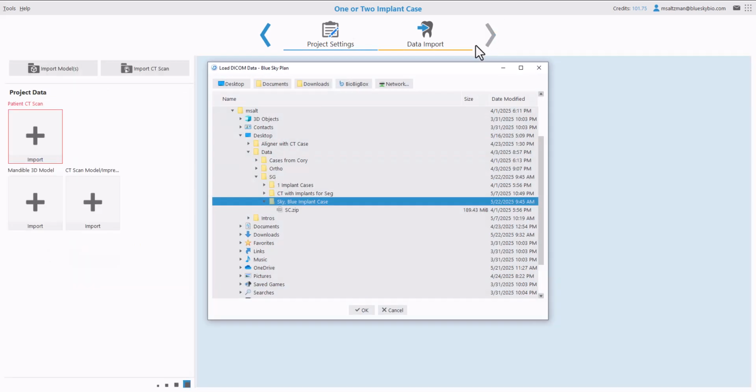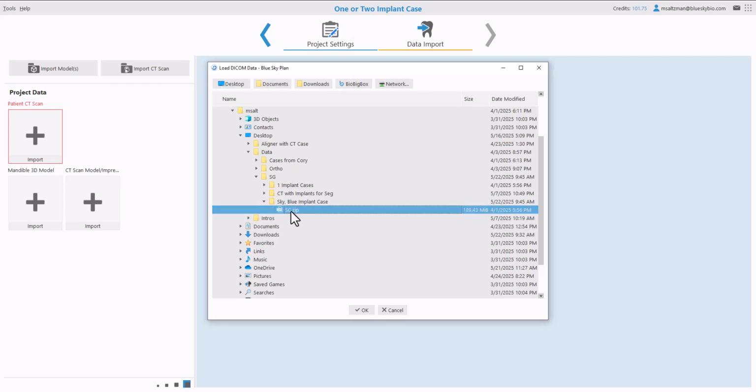to data import. The dialog box opens automatically on screen, prompting you to select the relevant CT scan. Use the library hierarchy on screen to navigate to the relevant location. You can take advantage of the shortcut buttons that we have going across the top for quick access. Left click once on the relevant CT scan, or on the folder that contains the relevant CT scan uncompressed DICOM images. Once you've selected the relevant CT scan, click the OK button.